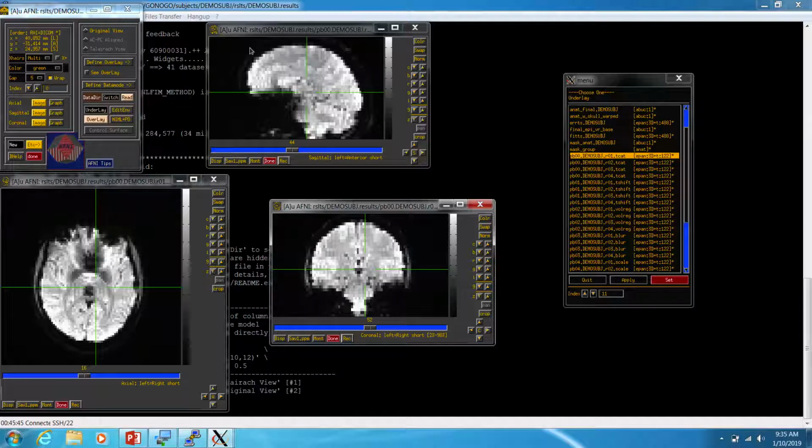The other thing you'll notice is there's a little bit of information here from the skull. And the trouble with the skull is things can be bright enough that if things aren't aligned right, you could be matching some part of the skull into some part of the brain, which is not so good.